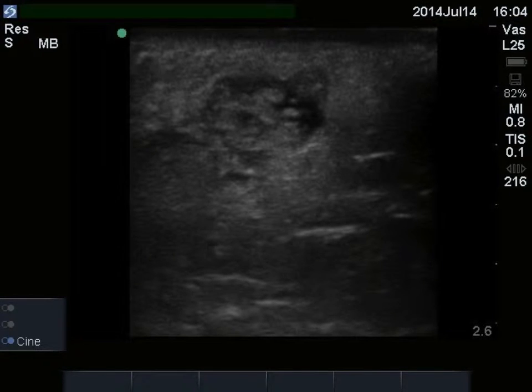This was an early skin or soft tissue infection in a young child. In this case, do you think there's posterior acoustic enhancement? There doesn't seem to be anything overt in this case, although there could be a little bit beginning. We would still need to check for swirling or a squish sign and also assess for vascular flow. But based on this image alone, there is no reason to poke it yet.